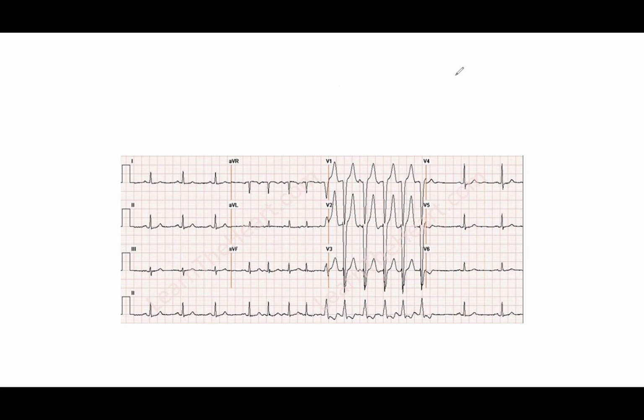In other words, an abnormal conduction of electricity. So if you have SVT but you also have a bundle branch block, then it's going to be a wide SVT, because the bundle branch block makes it wide. So things get a little crazy out there, okay? First things first, we're just doing bundles right now. What kind of bundle is it? This is a negative deflection in V1. Looks like an R wave. Oops, sorry, I circled the wrong one. R wave, right? So negative deflection in V1. V1 goes down, left bundle branch block, okay?